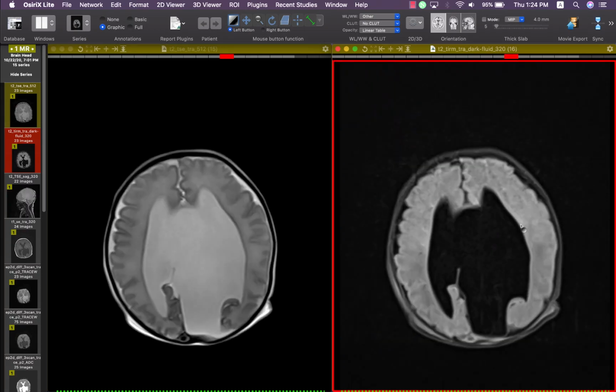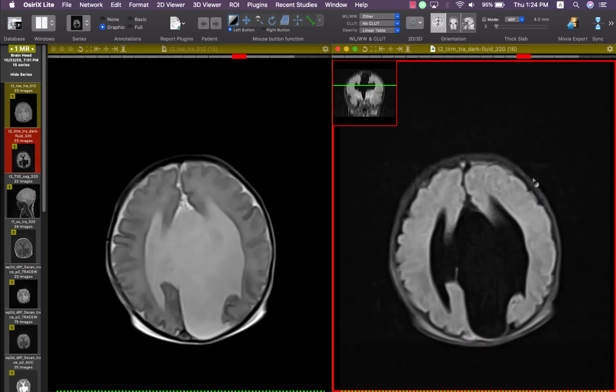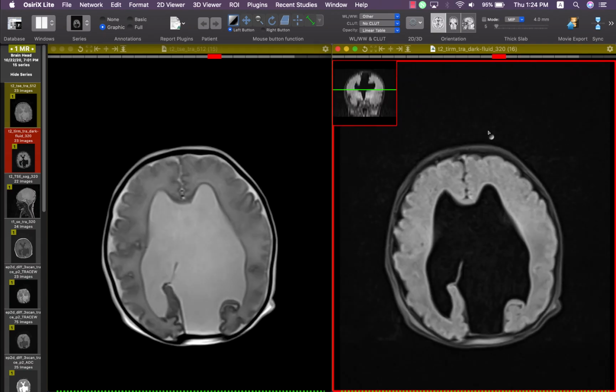And this is important because it usually affects the management. If it is type 1, you just put a drain in this cyst, and the patient is usually managed properly. But if there is an internal septation or loculation, you should cut these septations before you put a drain. So this is a typical case of corpus callosum agenesis with a type 1 interhemispheric fissure cyst.